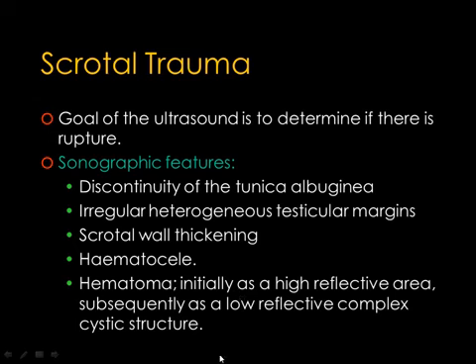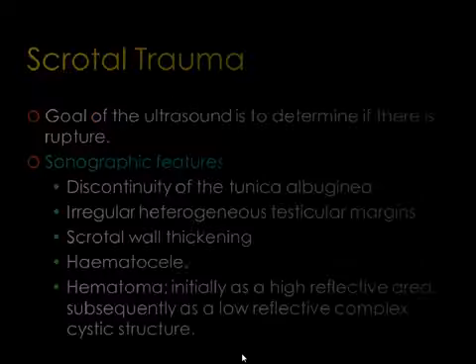Hematoma might be seen displacing the associated testis, initially as a high reflective area, but subsequently as a low reflective complex cystic structure. And in this case, color Doppler might be helpful in differentiating hematoma from other masses by identifying it as an area of no flow.